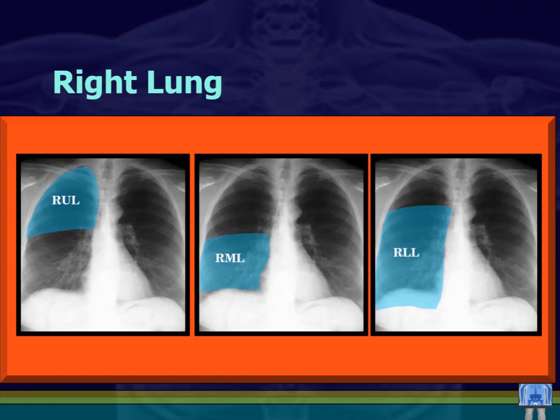Okay? In the case of a lung mass, it might get confusing in the right lower lobe, upper part, and the lower part of the right upper lobe. But for other pathologies, not so much.